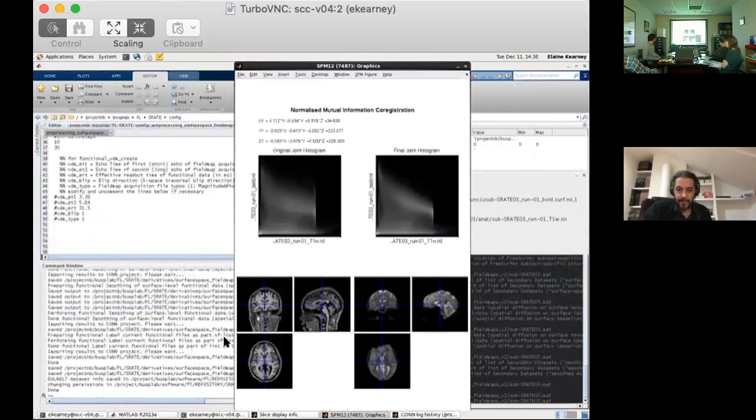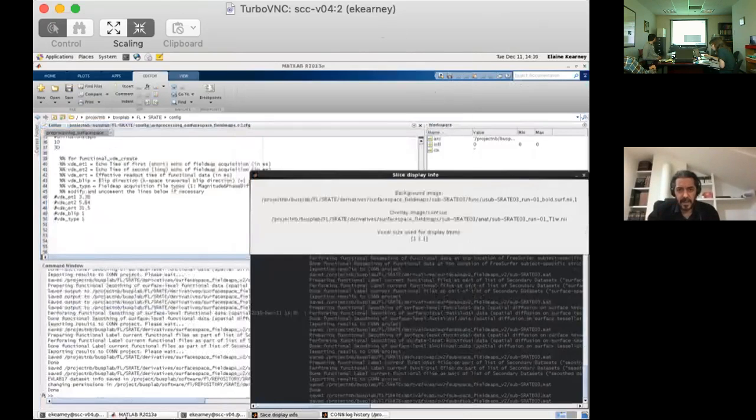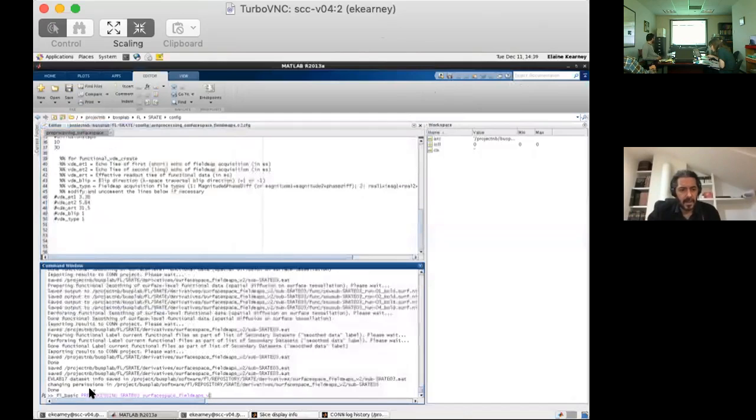Exactly. If you were to unwarp that, in an ideal scenario it should be kind of stretching it out. For every one that we saw, I think it would match the structurals better if that was done. Okay, so this has finished. So you can recreate the plots and see whether that improves them. Let's see.